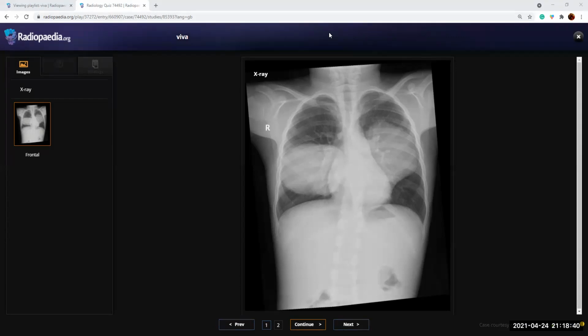Okay, if it was a phantom lesion, what would have been the shape and the location of these lesions? It will be in the fissural region, like in the horizontal fissure or in the oblique fissure usually. But the location is not that ideal. Okay. And a pleural lesion which was this large, would it? You specifically mentioned that there's no bony changes. Yeah, no bony changes. So do you expect it to be still pleural?